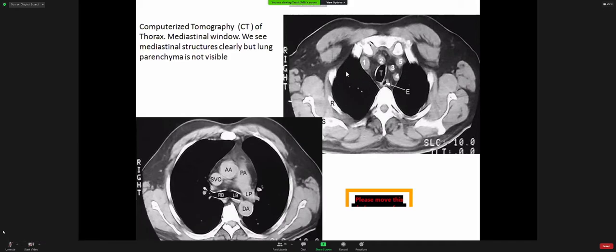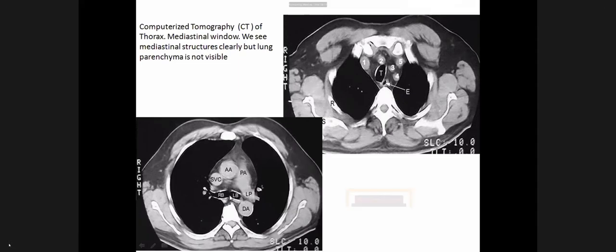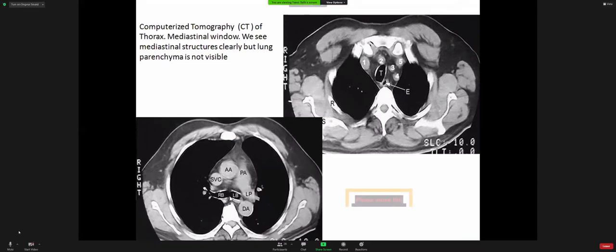I have no idea. The lung. Which you have to... Right lung. Right lung, and this is the left lung. What is this? Left primary bronchus. Yes, and this point? Carina. Yes, you are right. You are right.